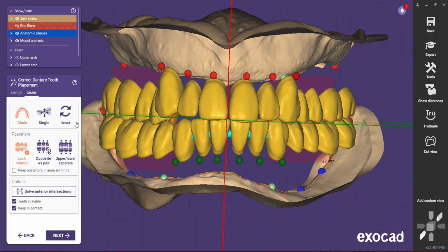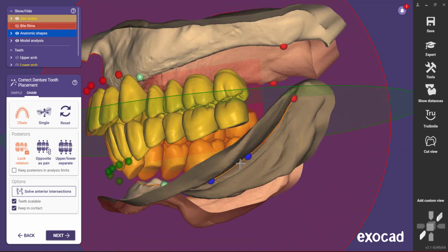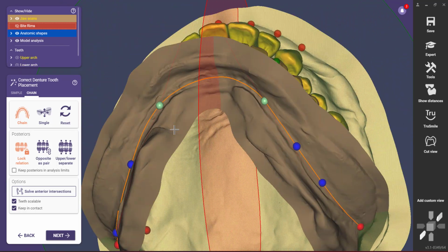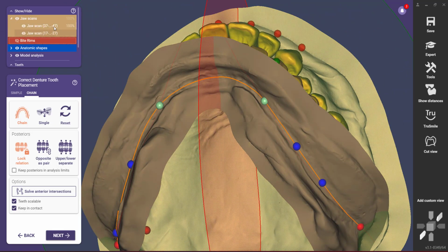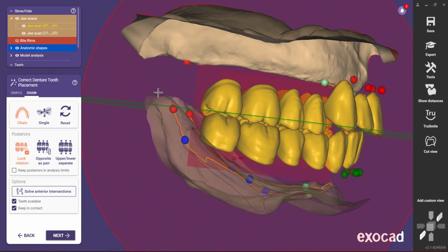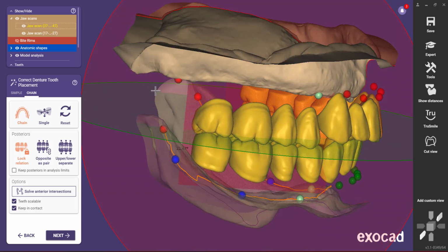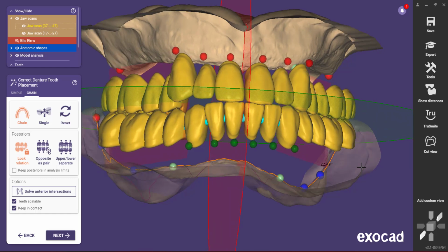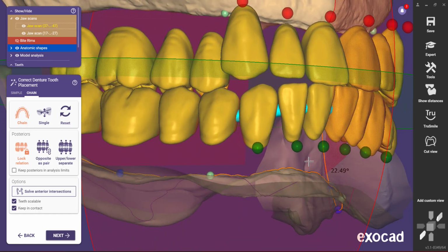All right, and that's just a sacrifice and a compromise you've got to be okay with, or the patient's got to be okay with, if they want this denture to not fall out every time they bite something with their anterior teeth. So I'm looking at that lower model, and I don't feel very comfortable going much further off the front of the ridge than that. I don't even really like it that much. So let's just stop there for the moment.